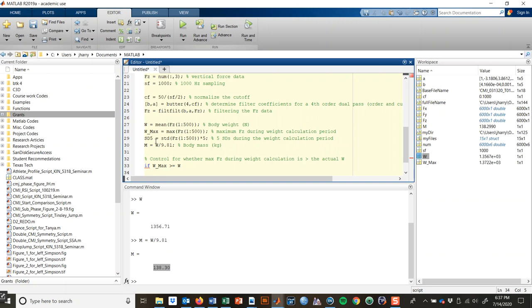I'm going to call this CMJ start 1, and hopefully we'll see why later. Because when we use the plus or minus, first we're going to look for whether or not there was an increase in force above the threshold. If that was not met, we'll look for a decrease. Do you increase force before you start the jump, versus do you just reduce force?